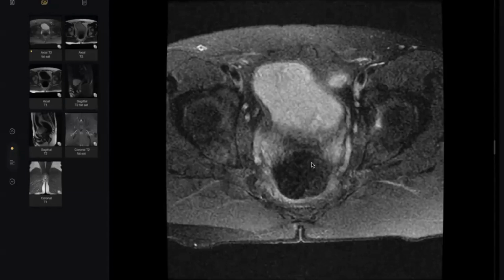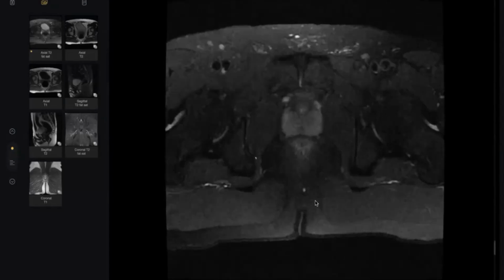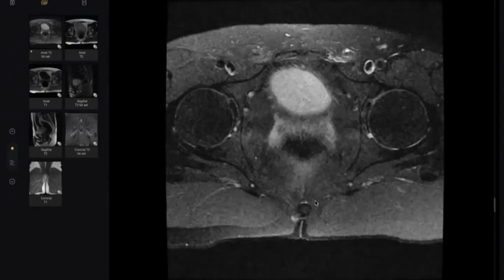It's a dermal something. Sir, I don't remember exactly. Sorry. Dermal sinus. Okay, it is a pilonidal sinus, sir. Pilonidal sinus, brilliant. Yes, sir. Thank you, doctor.